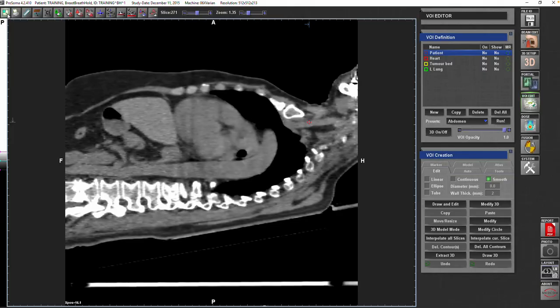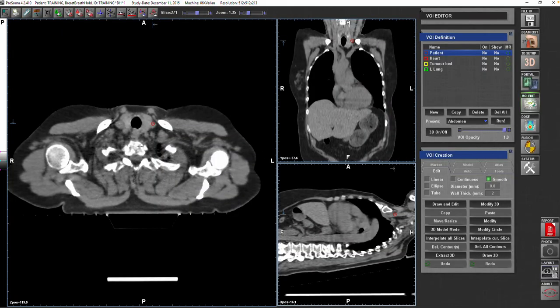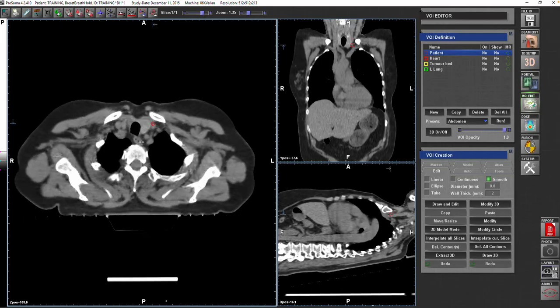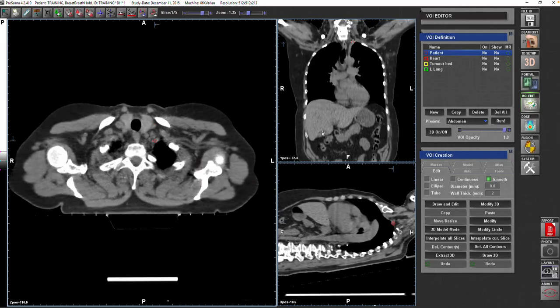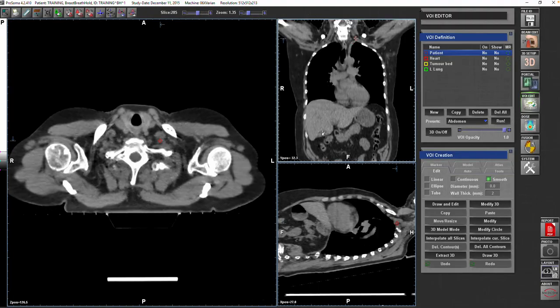So when we look at the arch of the subclavian artery at this level, the artery that we are going to follow, the idea is that at this level we don't have the vein yet. The subclavian vein didn't appear yet because we are still high up. When we go down and ventrally, then the vein will start to appear. So you can imagine the relationship between the artery and the vein. The vein is caudal and ventral to the artery.